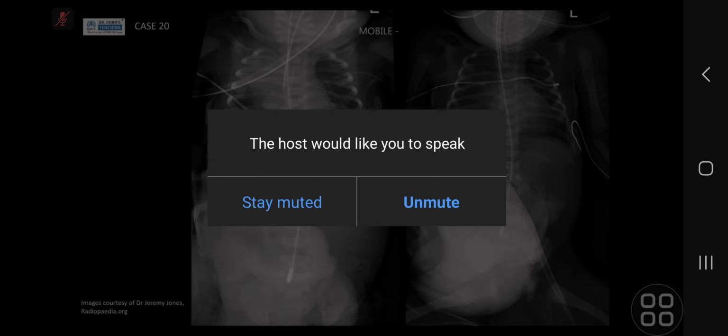Other than the stomach gas, I don't see any bowel gas in the abdomen. There's a lack of rectal gas as well. Okay. So maybe the stomach seems continuous with the structure on the right side of the abdomen, which could be external to this patient's abdomen. So what do you think is going on? I think the bowel loops are extruded from the abdomen.